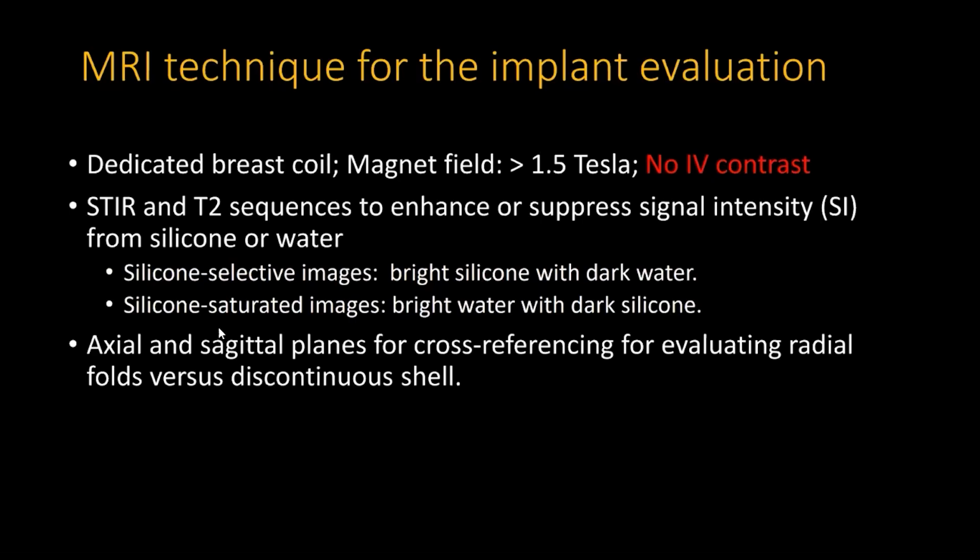On the contrary, on the silicone saturated imaging, the water will be bright and the silicone will be dark. Other than these two sequences, to either enhance or suppress the silicone and water signal intensity, we also need two different planes. One is the axial plane, one is the sagittal plane.